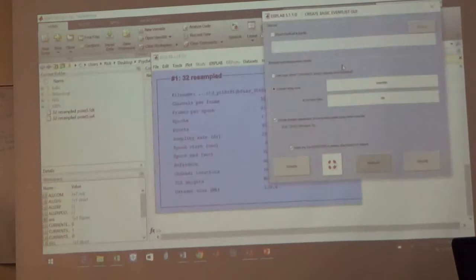So what you're going to have to do is shut down MATLAB, delete it. It's not going to delete something that's using it. So just shut down your MATLAB and then delete that folder, and then you'll have to catch up. Okay. It didn't work back here either.